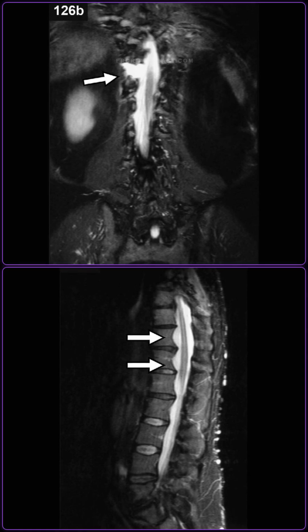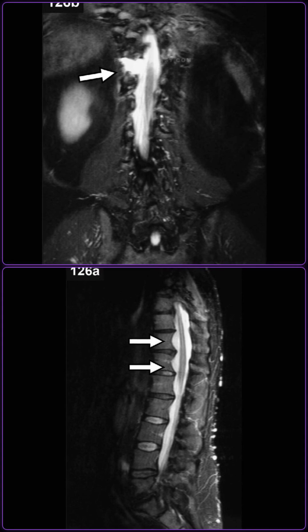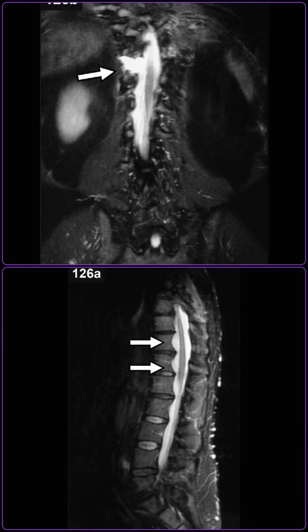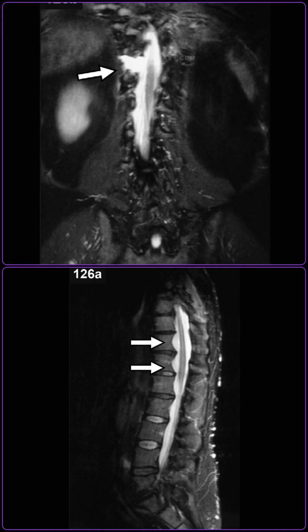On MRI, a lateral meningocele contains simple cerebrospinal fluid, showing low T1 signal, high T2 or STIR signal, and no internal solid tissue or enhancement. In contrast, a neurofibroma is a solid tumor that enhances avidly following gadolinium contrast administration.